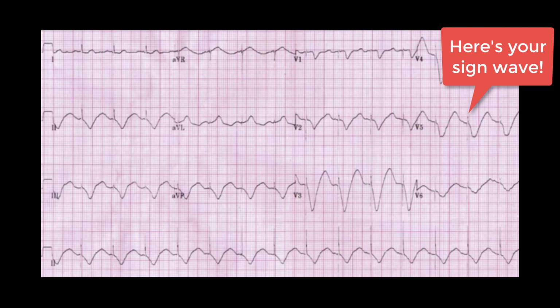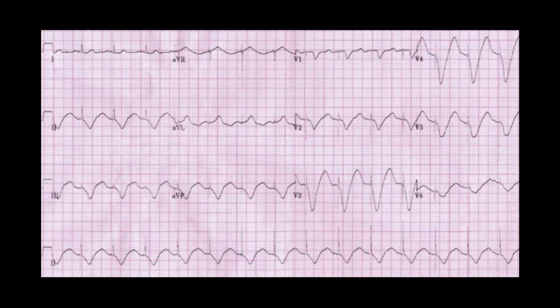So that sine wave is something very, very important that you need to just look at and be able to identify in the right clinical context. These patients are usually really sick looking or really chronically ill looking. And so a sine wave, again, is a pre-terminal rhythm. They won't last very long in this sine wave rhythm before progressing.